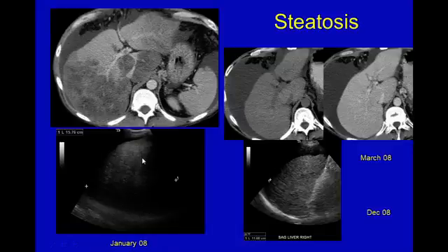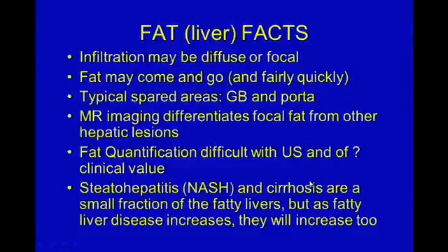And notice that this patient actually gets better quite quickly. This is a study in January. By March, the CT is completely normal again, and the ultrasound is also normal when the patient is re-imaged later in the year. So fat facts.